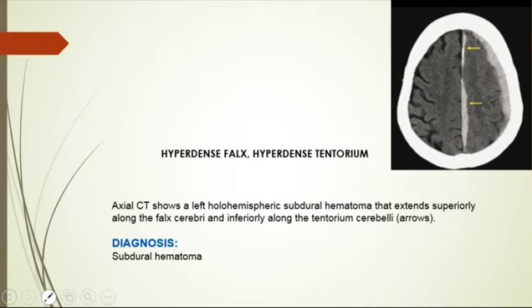The differential diagnosis for hyperdensity in the subdural space includes infectious, like subdural empyema, inflammatory, and neoplastic etiologies, which can readily be distinguished on the contrast enhanced images. Okay? Good job.